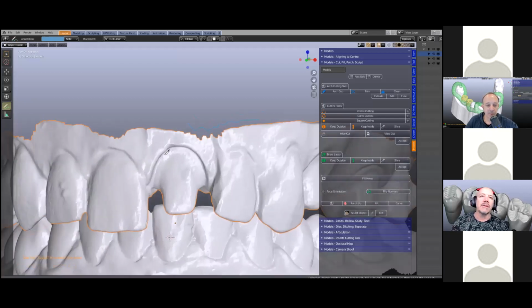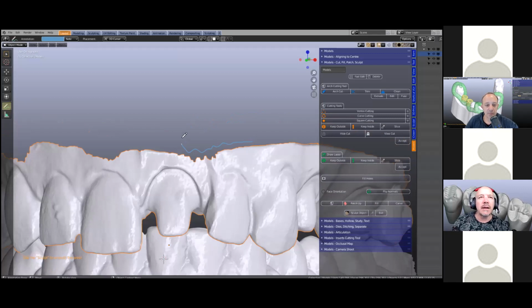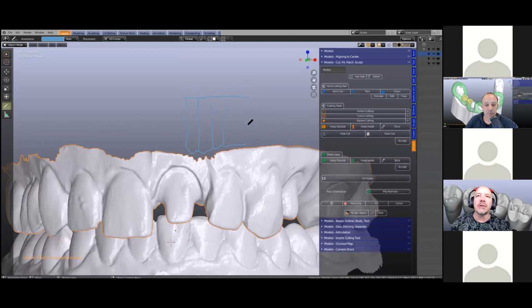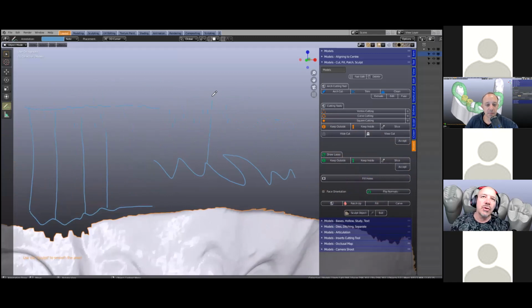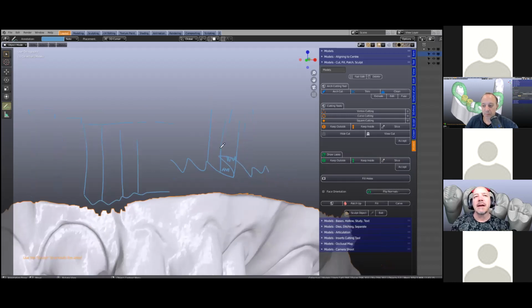That's fine, because we smooth that edge down in our algorithm so that we can then extrude it going upwards into our beautiful base. But if your edge looks something like this and it comes like this, now this is the big problem, because as we extrude this edge going up, we've got problems here because these are intersecting each other, and they can also be inside out.